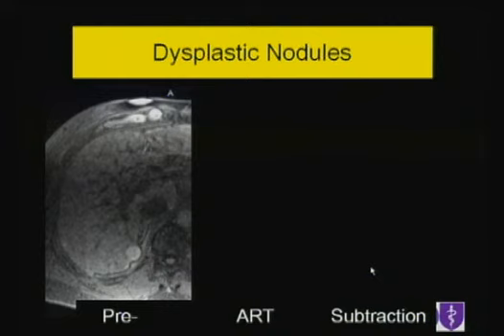So I'm not going to spend too much time on description of nodules, but you can encounter dysplastic nodules in the liver, in the cirrhotic liver, that can be bright on T1, as Dr. Lee told you before. So these can be due to copper deposition, fat, or hemorrhage sometimes, or sometimes even Fe3+, like iron in the 3+ form, can also give bright signal on T1.